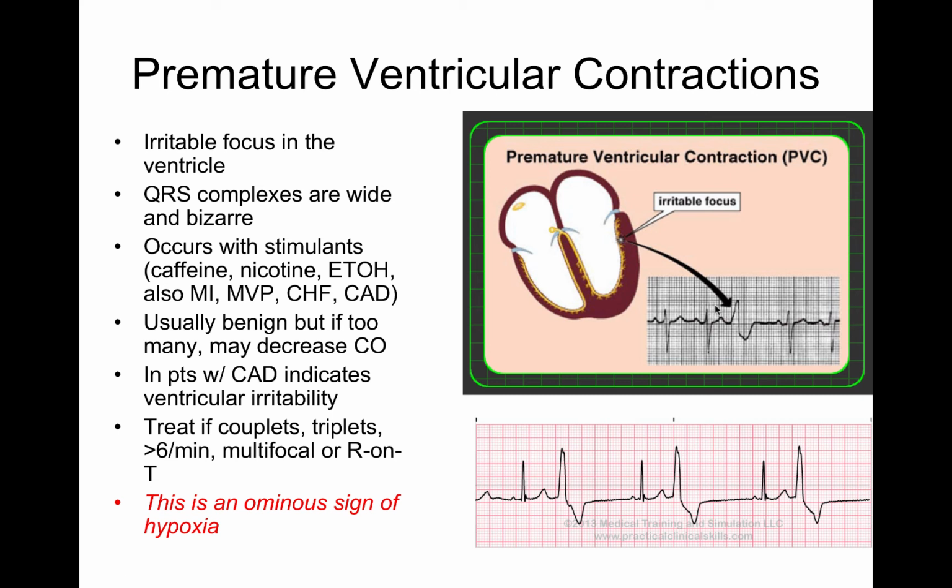We monitor these PVCs. PVCs can be indicative of an abnormal focus that produces a wide QRS complex. It's a different beat that's premature, that comes where it shouldn't have, and it's not going to look the same as a normal one, so you're going to see a wider QRS complex.